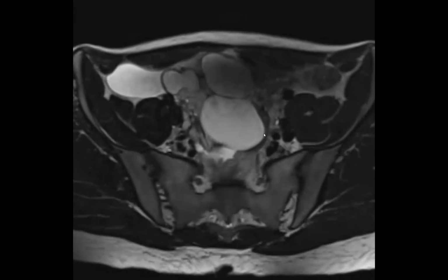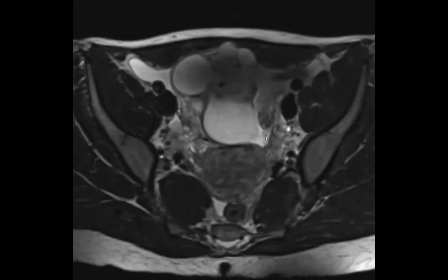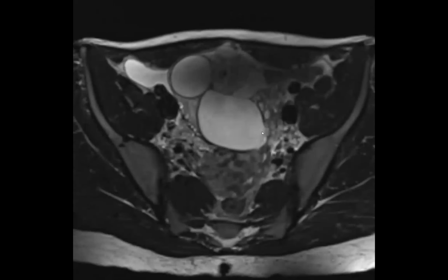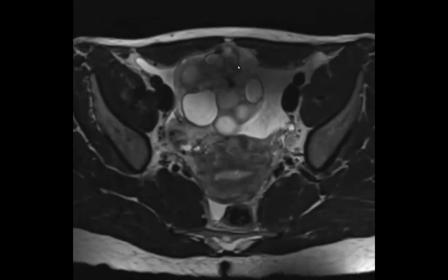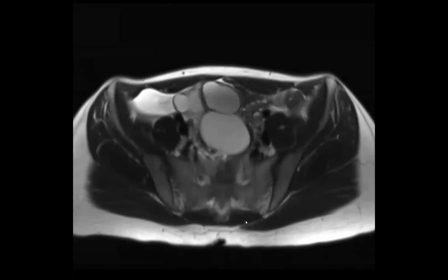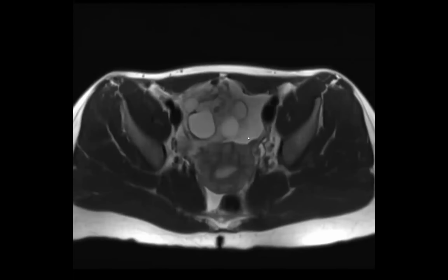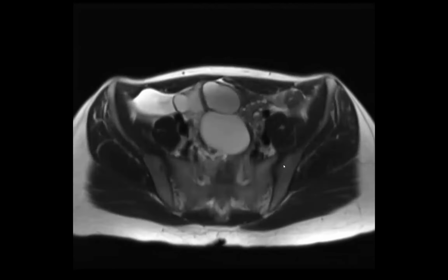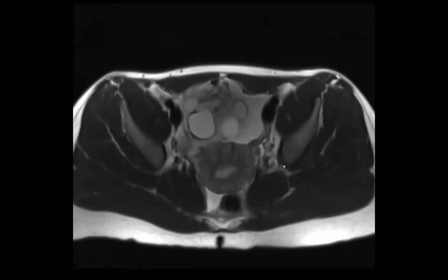Patients can get thyroid toxicosis. So if they have a thyroid storm or hyperthyroidism and you have an ovarian mass, that's something to think about. It overlaps with other epithelial neoplasms, so it's basically a retrospective diagnosis unless their thyroid hormones are elevated. It can have multiple different cystic components with different shades of gray, sometimes with some really T2 dark areas, but basically it's a surgical lesion.